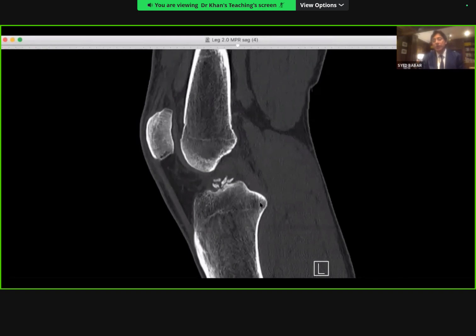So this is how I would attempt it. And in my summary, I would say to the examiner, the appearances would be consistent with an avulsion fracture of the ACL, which may well be long-standing because there's no joint effusion. However, there is an acute element which involves edema of the MCL, which is a grade 1 sprain, and bone marrow edema at the lateral femoral condyle and the posterolateral tibial corner with an associated vertical cleft tear of the lateral meniscus.